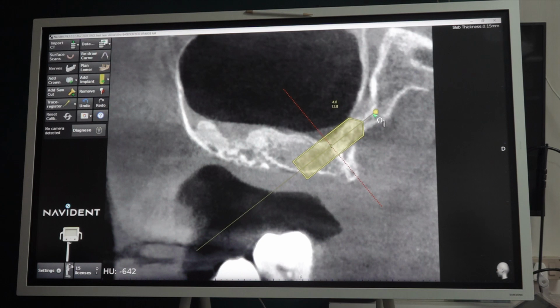So you have to tilt like this, right? It is more tilting. So what we are going to do is reduce the tilting but move distal. Now somehow converting the 4 into 3.8, because we are going to use 3.75. Now it looks okay.